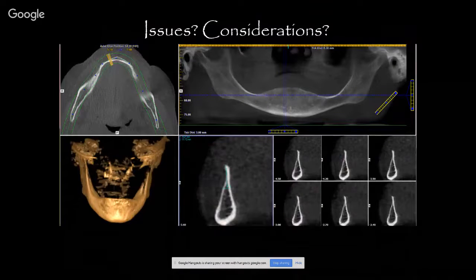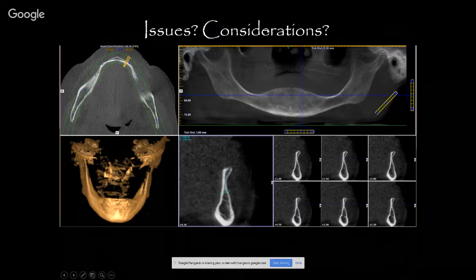Looking at some slices of the CT images, this might be difficult for everyone to see, but to get down to this cross section here, this is 4.2 millimeters, and from the tip of the mandibular anterior ridge all the way down to this portion is 11.7, so almost 12 millimeters till we actually get into some good bone. And here's another slice on the opposite side. So you can tell that for the first 12 millimeters, it takes till you get down to good bone at 4.5 millimeters.